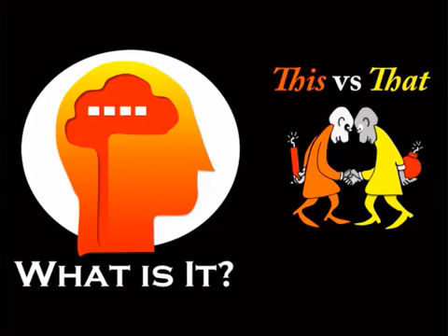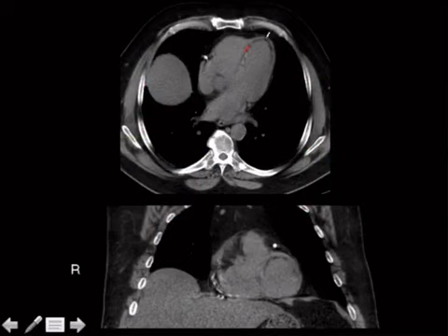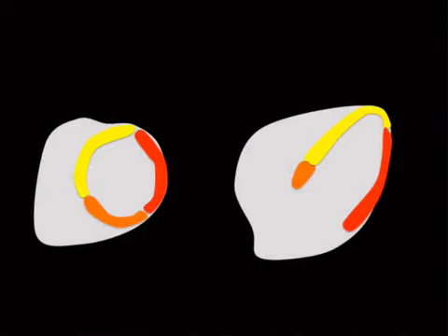So let's look at our first case here. This is just an anatomy review. This is the same case that I showed in the chest module, where we've got fat deposition in a subendocardial pattern, and it's following a specific vascular distribution, that one. And if you remember, that is an LAD distribution. The orange is RCA, and the red is circumflex.